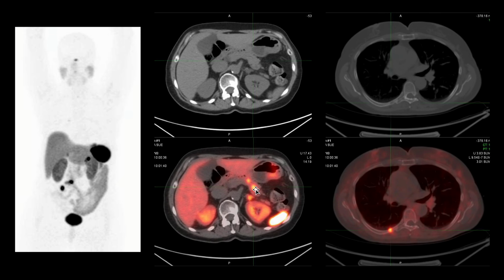And I think since this radiopharmaceutical and the scan, gallium-68 DOTATATE PET-CT, is so sensitive and specific, as we gather more experience with this technology, we will find more cancers being detected, and the question would be how to clinically deal with these tumors. Most of these neuroendocrine tumors are differentiated tumors. They're slow growing, so maybe wait and watch would be a good policy for these tumors, but we definitely will see additional tumors in these patients.